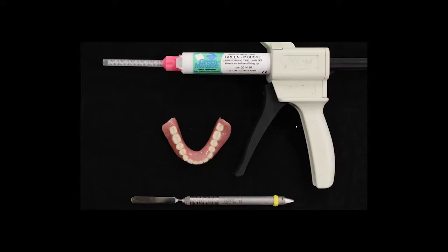We'll start with the Green-Mousse scanning protocol. Dr. Michael Scherer has worked to develop this protocol, and it's extremely effective. It'll allow us to scan patients wearing their dentures without, 1, having to drill the dentures and add radiopaque beads, or 2, mixing a messy and inconsistent barium lining to separate the surfaces. Each guide company will require some sort of fiduciary marker, and this protocol is simple, consistent, and produces less distracting scatter in your images. And it doesn't require your office to do a lot of work before seeing the CT scan and knowing if the patient is going to be a good candidate for implants.